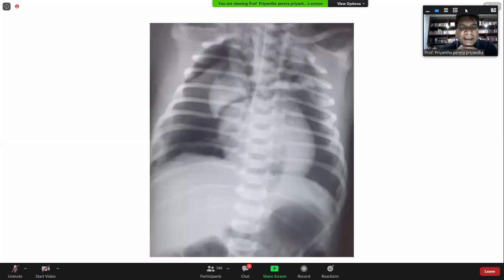So due to what? Due to pericardial effusion. Is there effusion here? Rib fracture causing bleeding into the pericardial cavity. Cardiac tamponade due to pneumopericardium, right? Not fluid, air in the pericardium.